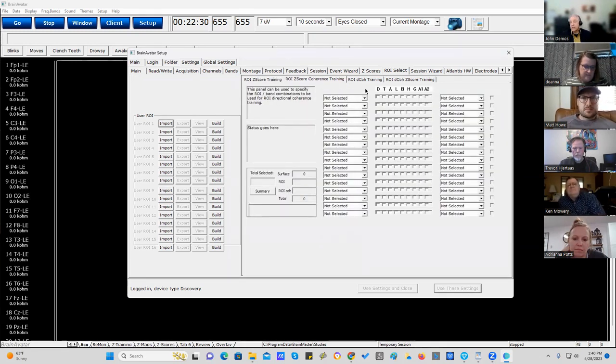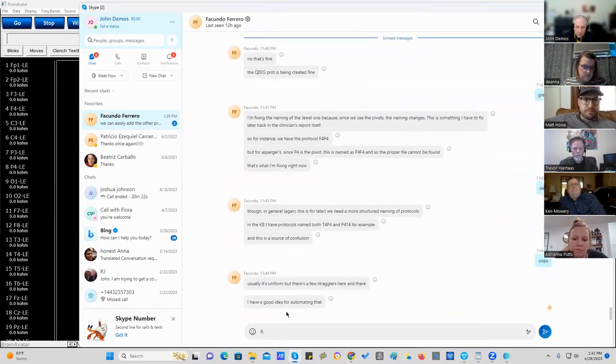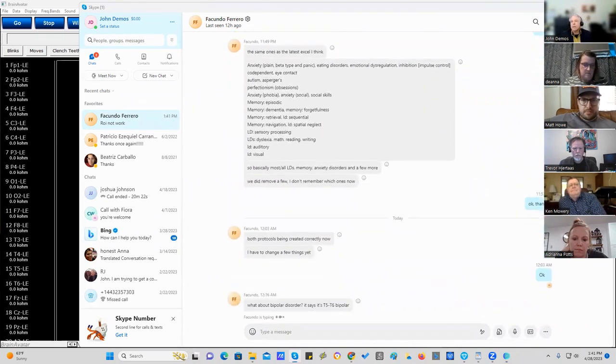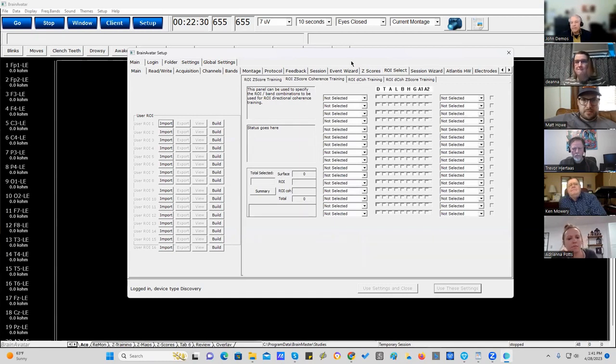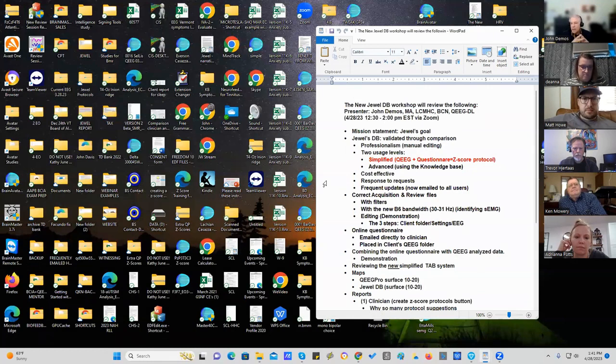I apologize for this. But now you told me something to tell my programmer. Okay, I just wrote them. So that'll be fixed on the next one. Ordinarily, it would populate this page, and then you just begin training. It would also populate on all the sites that you had. It would do coherence between the sites you chose.